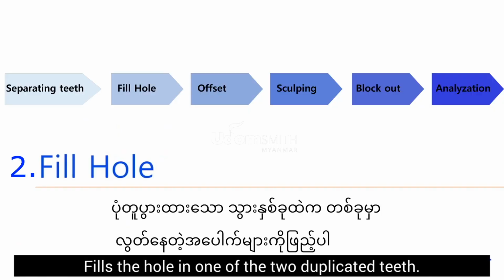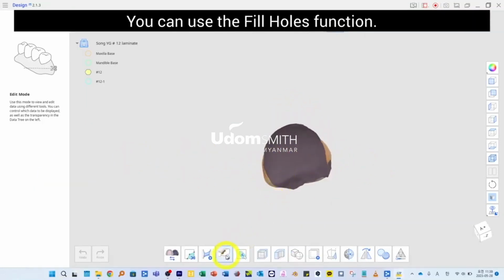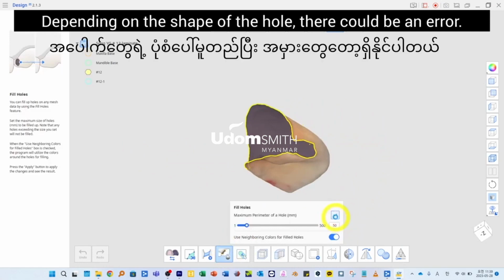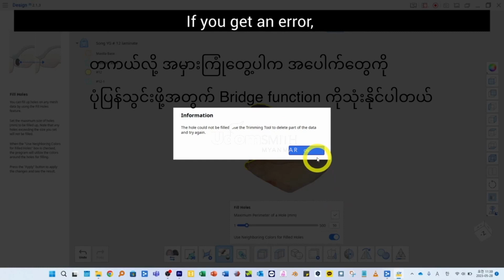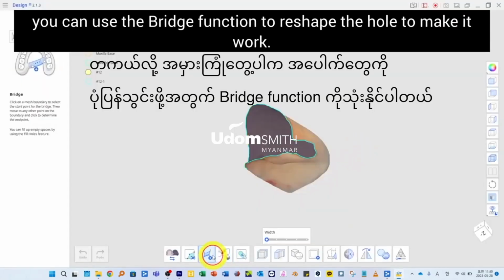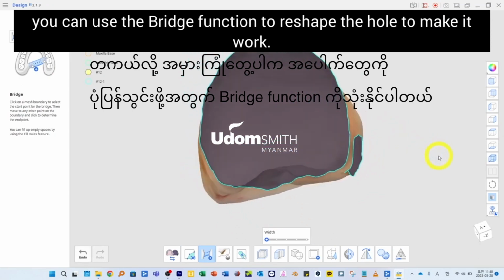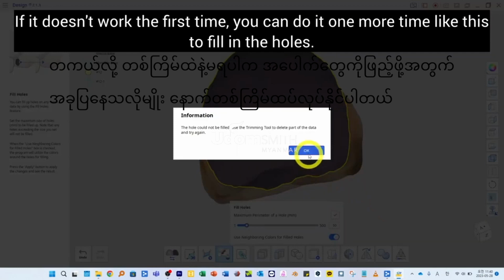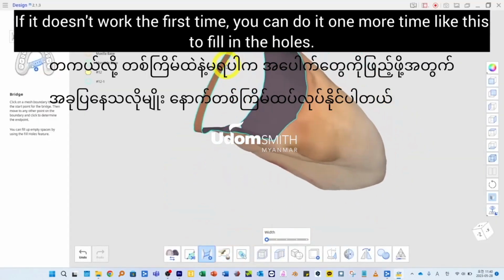Fill the hole in one of the two duplicated teeth. You can use the Fill Hole function. Depending on the shape of the hole, there could be an error. If you get an error, you can use the bridge function to reshape the hole to make it work. If it doesn't work the first time, you can do it one more time like this to fill in the holes.